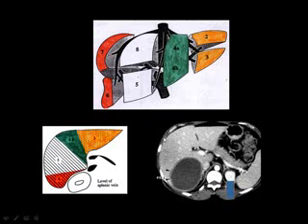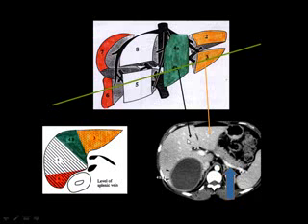The anatomic landmark for the inferior segments is the splenic vein, which is running posterior to the pancreatic tail. And you may have the pancreatic tail as a reference. If you see the pancreatic tail or the splenic vein, then you know that you are cutting in the inferior segments. Then this is the plane of cut, and this will be segment 3, and this is 4, this is 5, and this abscess will be in segment number 6.